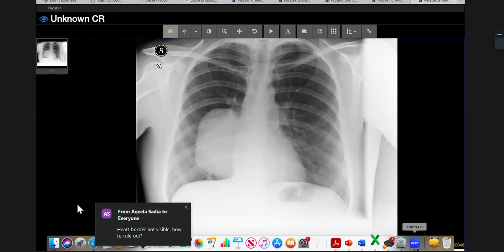That's more than three, isn't it? So, yeah, those would be my differentials. Solitary fibrous tumor, possibly. If you throw that in there, I don't mind. Meningocele, that's a good one. I like these offerings people are giving us here. Anyway, this was a schwannoma. And here we go. The mystery guests: NF, cyst, rarely lymphoma. I like all of those.